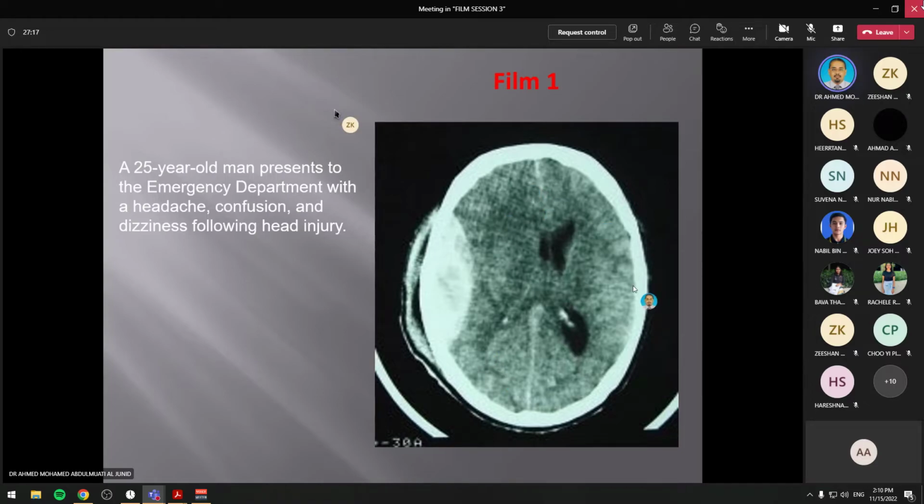You see with the opposite side. If you see this one, you can see the cortical sulci a little bit here and here and here, because this is a young patient, and in a young patient the brain is tight to the skull, so the cortical sulci will not be prominent, but you can see a little bit here. I can see it on the left side, but here it's all effaced. So I can write: effacement of the cortical sulci of the right frontoparietal region.